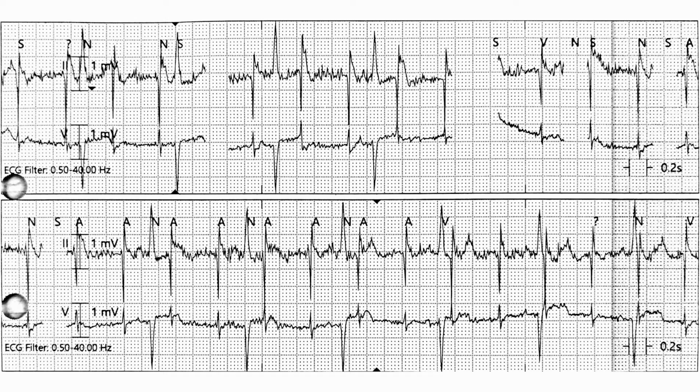And there's something very interesting happening right here. We see a narrow QRS in the early part of the ST segment of a wide QRS. And this is non-physiologic. You can't have a QRS in the ST segment of another QRS. It's because the first QRS has finished depolarizing the ventricles, and the ventricles are not able to be depolarized again until the myocardium recovers, which generally happens towards the end of the ST segment. So right away, I'm suspicious one of these QRS complexes is non-physiologic.